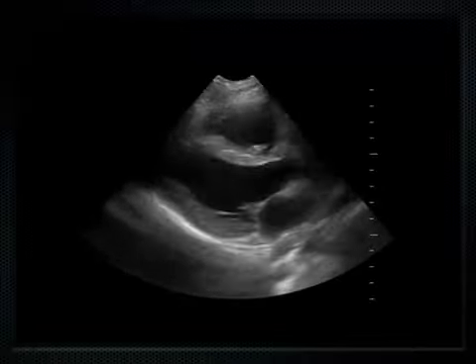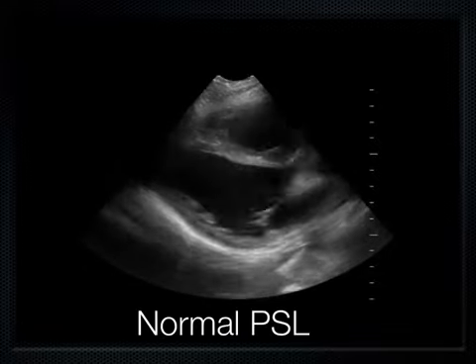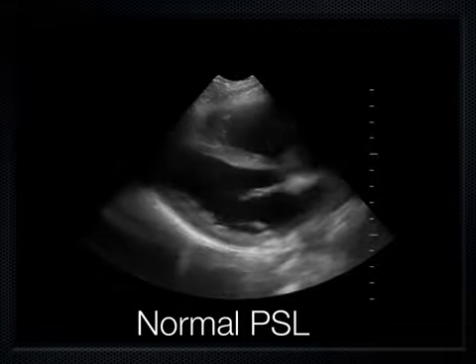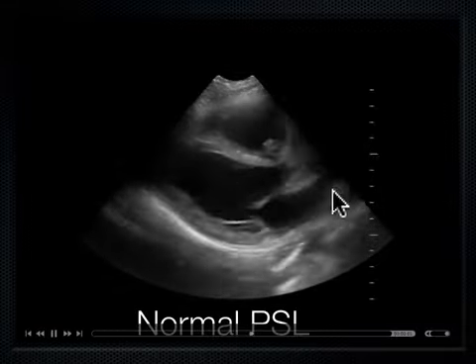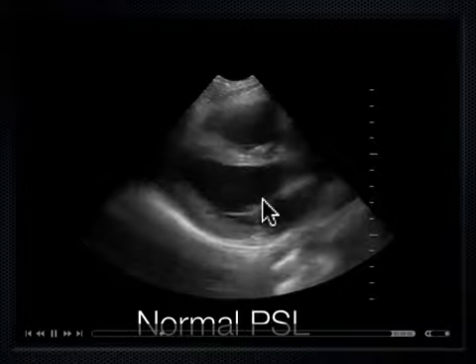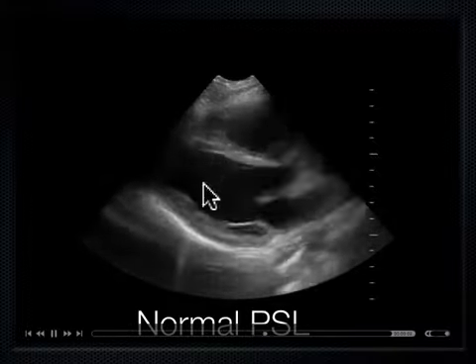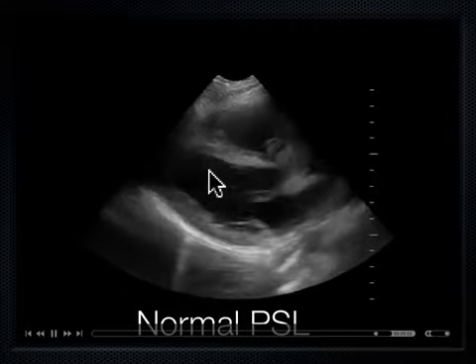And this is what it looks like in all its glory, a nice normal-looking parasternal long axis. And I say normal because when I look at this, I'm looking for really two main things. I'm looking for that this mitral valve comes up and smacks that septum, and then number two, that this posterior wall and this interventricular septum make their way towards each other. And indeed, they are doing that in this view.